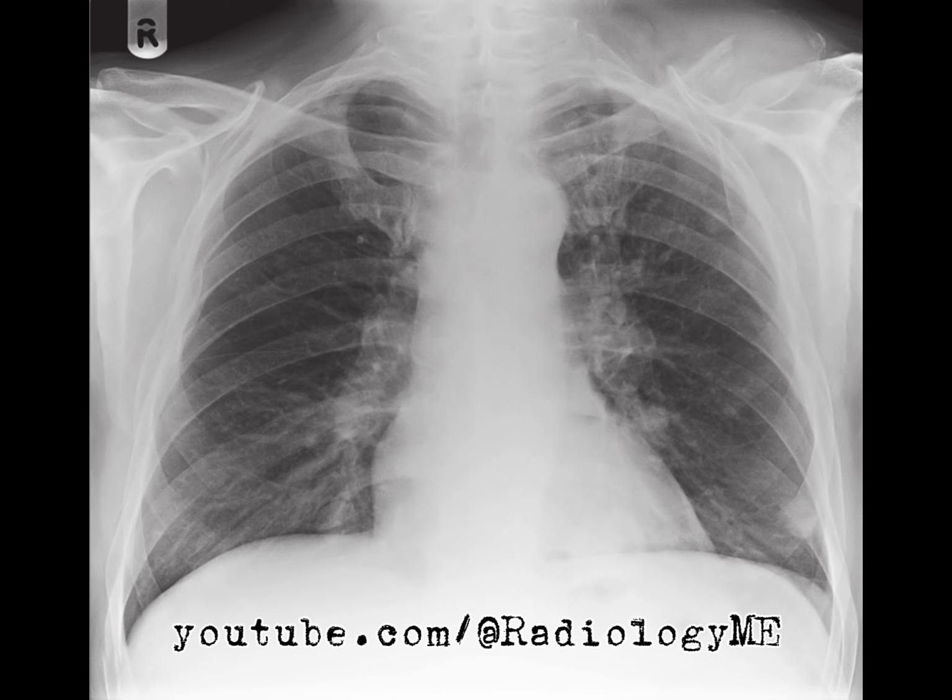Now, when I examine the hilum, I see that the left hilum is particularly bulky. It has an irregular outline, and I can't identify the normal hilar point. It's worth noting because hilar enlargement can be caused by a few things, most commonly lymphadenopathy or a mass.